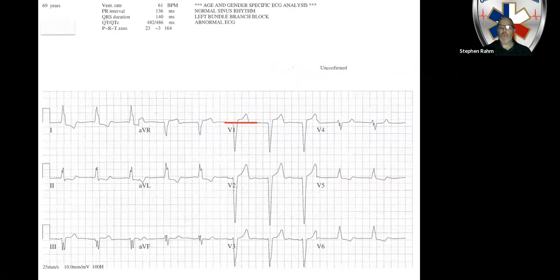And again, if I drew a horizontal line through my QRS complex up there in lead V1, you'll notice the first, in fact, in this case, the only complete triangle that I make is pointed down. So this tells me I have a terminal S wave in lead V1. And if I look out here in leads 1, aVL, and down here in V6, even in V5, you have these monomorphic R waves. And again, that's representative of that terminal wave moving towards those particular leads to give you those monomorphic R waves.